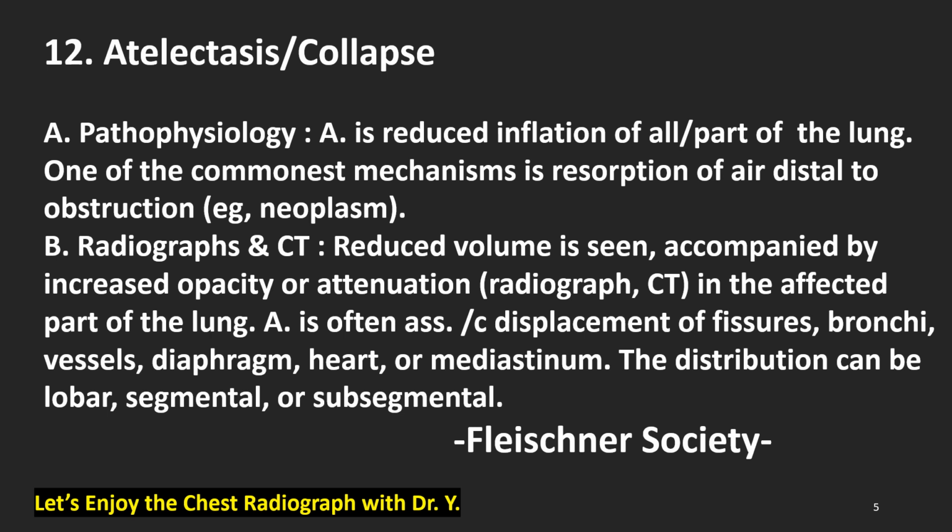Reduced volume is seen, accompanied by increased opacity or attenuation, on radiograph or CAT scan, in the affected part of the lung.